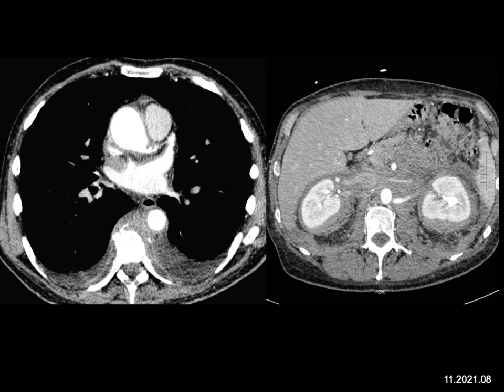It's classic for giving what looks like bulky adenopathy and infiltration, looking in part like retroperitoneal fibrosis, which in part it is, but then also involving the chest. It's interesting. It's a triad of diffuse septal interstitial lung disease, pleural thickening, perirenal encasement, and sclerotic bone lesions. It's also known as non-Langerhans cell histiocytosis of unknown etiology. We are seeing more cases of Erdheim-Chester disease. One of the classic things is that perirenal fat being effaced or infiltrated by soft tissue, usually bilateral, often symmetric.